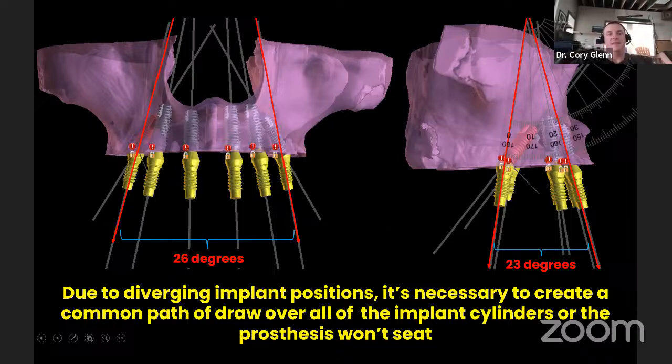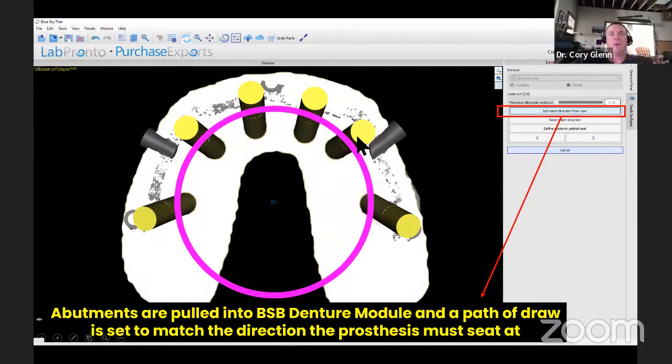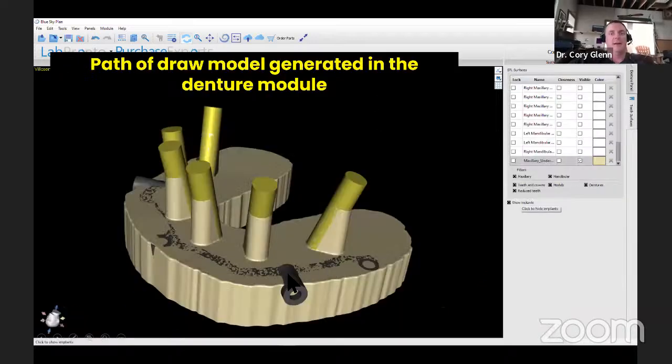So something I'll do is I'll actually build in a path of draw over the top of all of these at once. And then that is what I subtract for my holes. So the way I do that is I hack the denture module. I'm going to just tell it to set my insertion direction from a particular view where I'm looking down over all of those abutments. And the first step of the denture fabrication process is to create the blockout model. So I'll tell it, don't allow any blockouts. And I get this. All right.